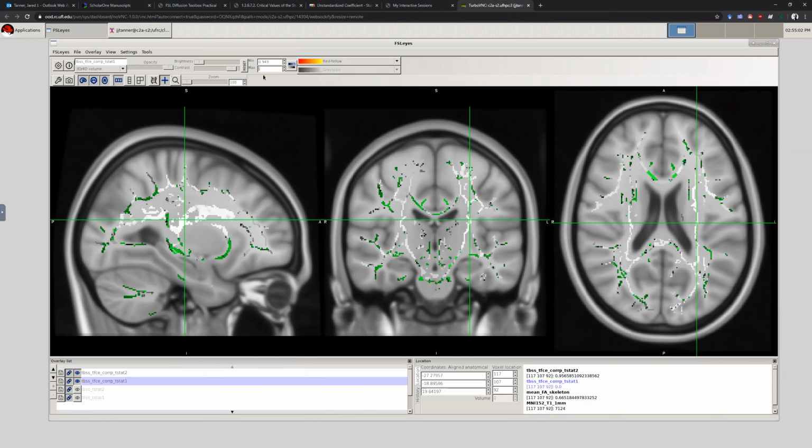And as we might expect, if the maximum value in there was about 0.28, we're not going to have any values above 0.949. So we're not going to see any areas in the brain that are red, yellow. T-stat2, on the other hand, our maximum value is 0.957.